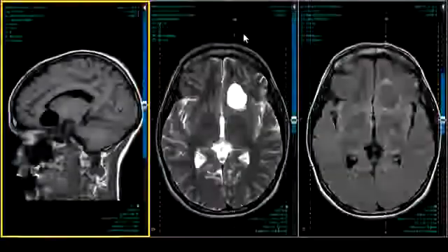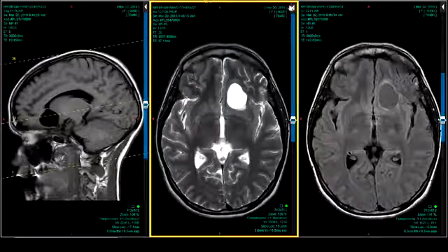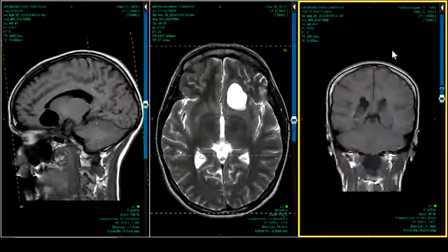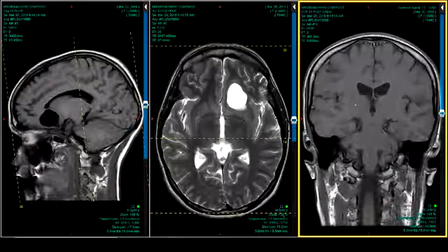All right, the next case is a 32-year-old female, and she's got a pilocytic astrocytoma, status post left-sided craniotomy. Yeah, so this is a good one because we've already given you the diagnosis, but it's a pattern you should recognize, but in a different location. That's what's interesting about this case.